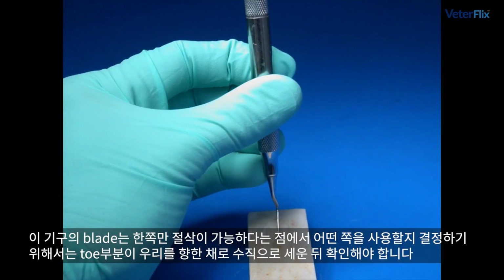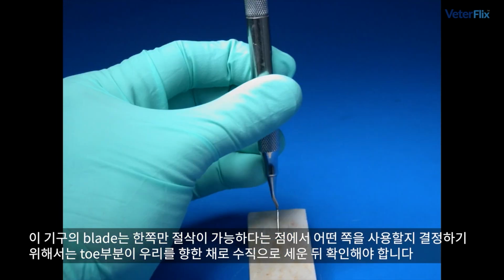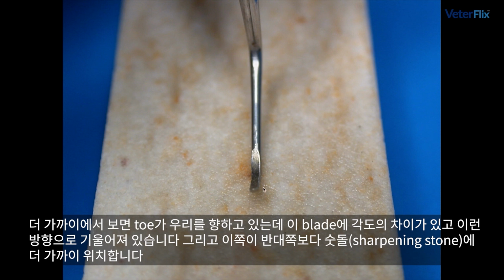So in order to be able to determine what side of that instrument to use, in that there's only one of these blade margins that actually cut, we need to look at it from a head-on standpoint with the toe facing us with the instrument perpendicular to us. And if we look up closely, you can see the toe is pointing at us.